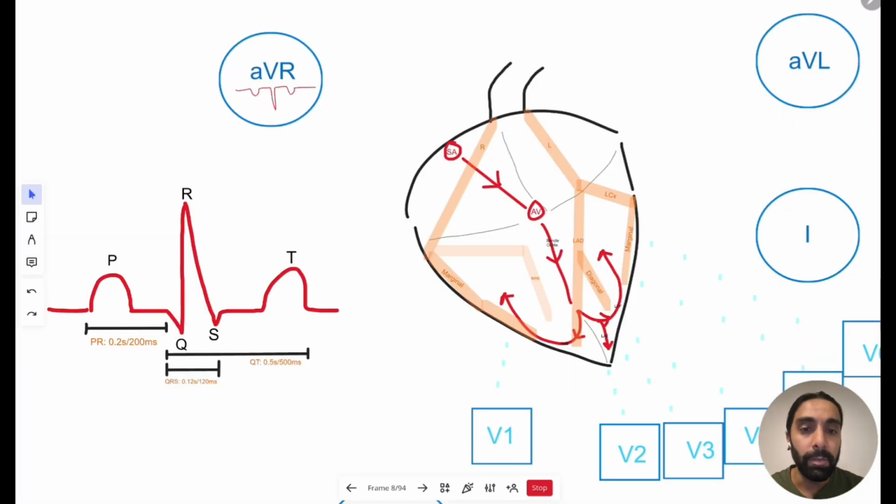And if you think about it, in lead 2 everything is upward, and that's what we are kind of used to seeing with our eyes. AVR is in the opposite direction, so it makes sense for everything to look upside down. And V1, if you add that 3-dimensional approach to it, everything is going away from V1 as far as the depolarization goes, so V1 sees everything as upside down as well.